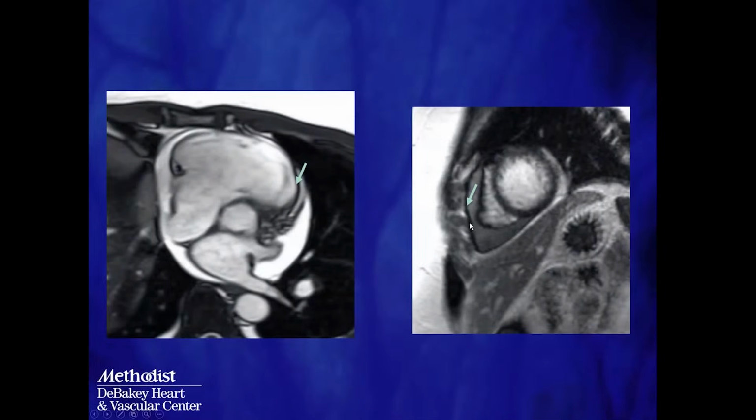And this is typically what we see here, this black artifact in this patient who has a pericardial fluid or a pericardial effusion, and then there is also the epicardial fat. So this fat-water space can create this chemical shift or a cancellation artifact because of that.